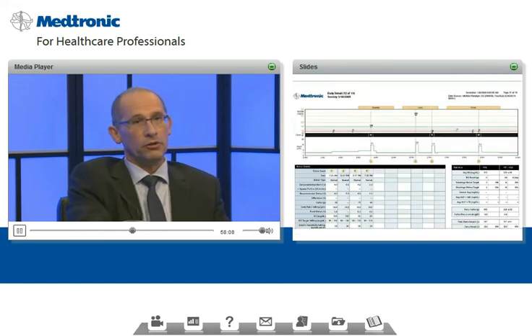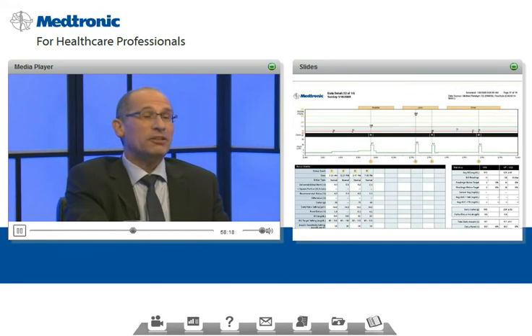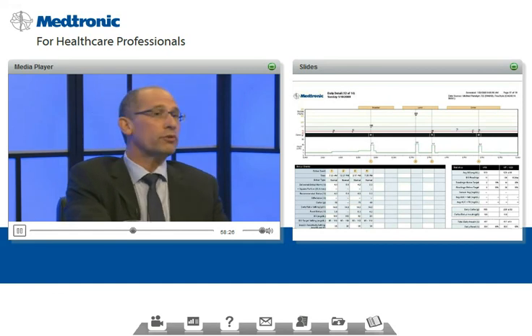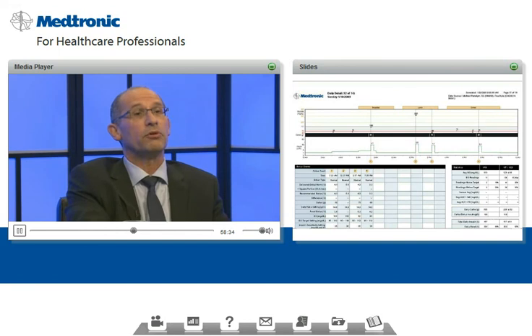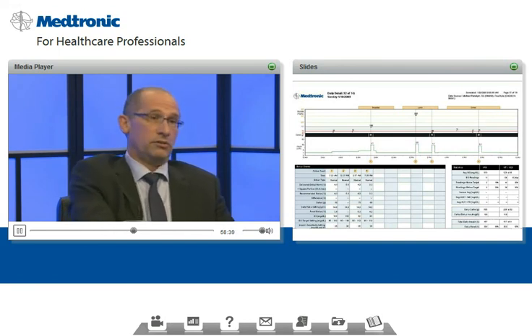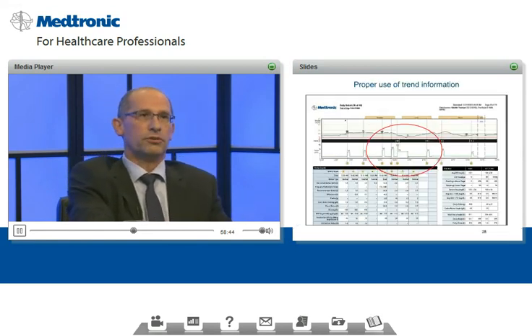On the opposite, look here at lunchtime at bolus number 2. In bolus number 2, the patient has not eaten for at least 3 to 4 hours. His blood glucose was high, and he corrected it without ingesting carbohydrates. So this is a pure correction bolus. In this case, correcting the bolus according to the wizard and according to the specification caused a hypoglycemic event. Again, hinting to the fact that it might be that the bolus correction is too high. You have to maybe modify it a bit. Again, it's oversimplifying, but it gives you some kind of a hint on what to change.